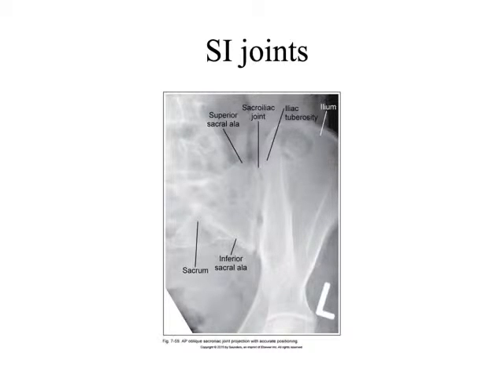So even though it may seem a little childish, what we're seeing is the SI joint. Not only is it centered on the image, it's demonstrated without any superimposition, and it is not magnified or elongated or distorted, right? If we had the patient tilted, we might get some magnification or distortion of this anatomy. So we have the SI joint centered without magnification or distortion.